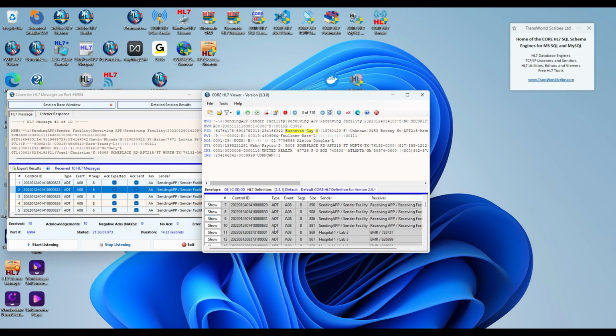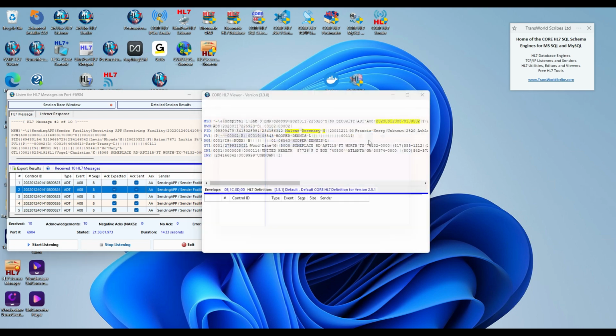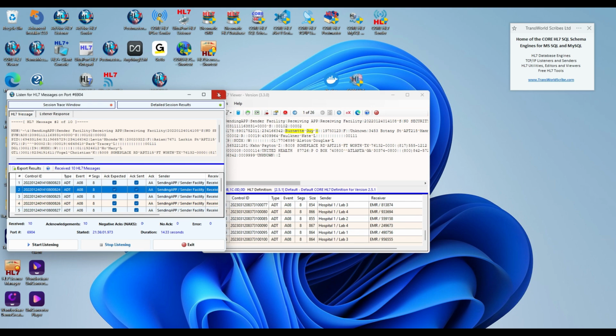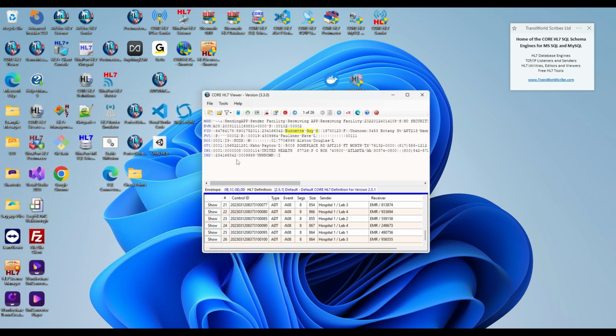So starting on message number 11, 12, that was the previous message load. I could now run my filter, etc. Run it. This time it found 26, and you see how this can be very, very helpful for working with HL7. And that's the end of this video.